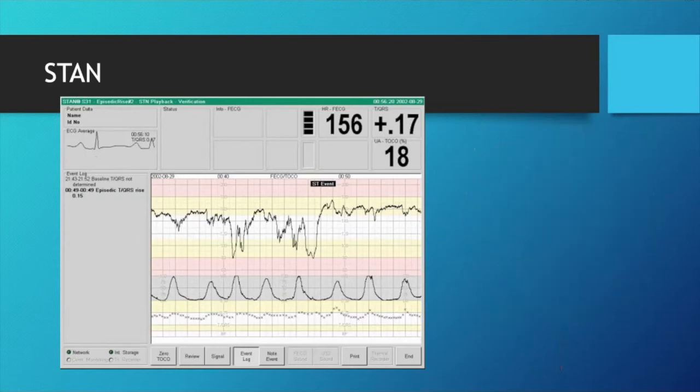And as we said, this baby is within mom. So there is a possibility that we can be picking up mom's ECG. The theoretical assumption is that because the P wave is so small in most ECGs, if you're picking up a P wave, you are usually correctly picking up baby's ECG. If you can't see a P wave, then most likely you are picking up mom's ECG. So you have to be able to look at this and see, okay, there is a P wave, there's a QRS complex, and then there's a T wave. So that means I am picking up baby. Does that make sense?